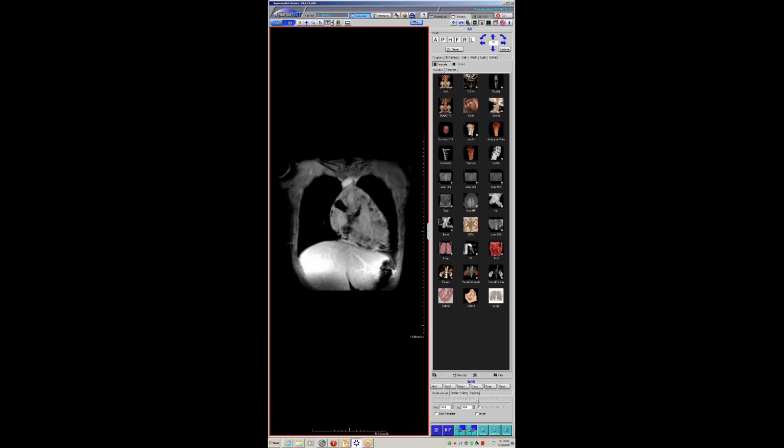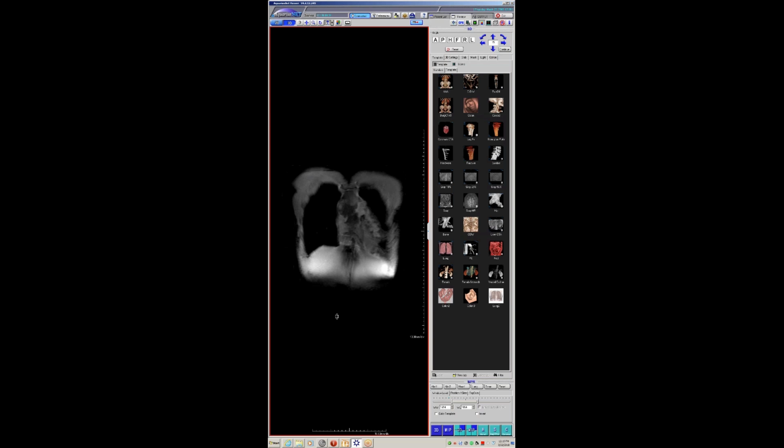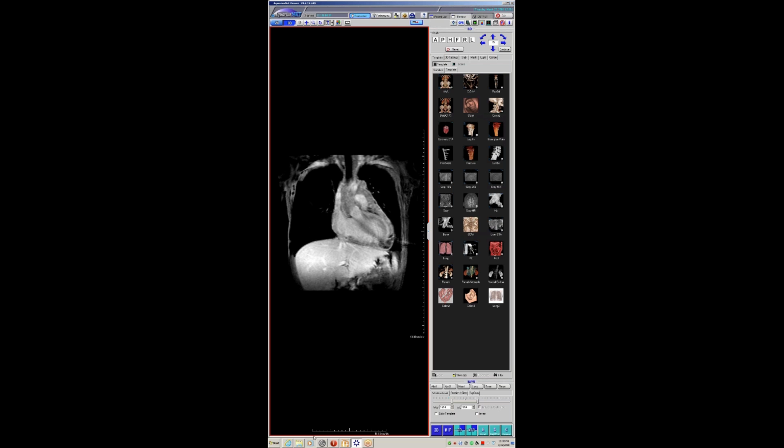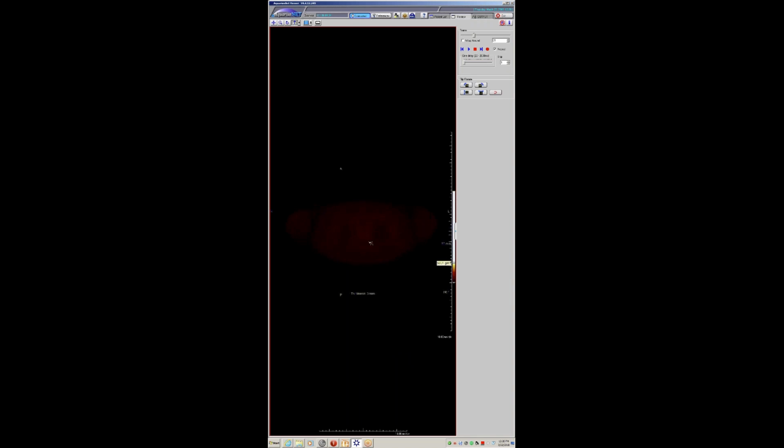And he underwent a biopsy and presumably a primary pericardial lesion, although it could be metastatic for something, although he had no disease elsewhere. And the most common primary pericardial tumor is, of course, mesothelioma. Pericardium, just like the pleura, is lined by mesothelial cells. So this was a primary pericardial mesothelioma. Here's diffuse PET CT.